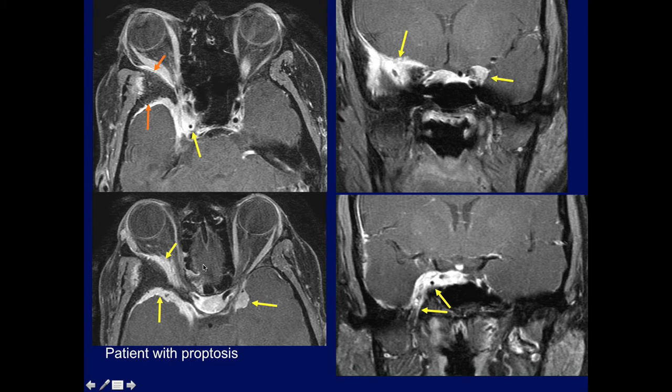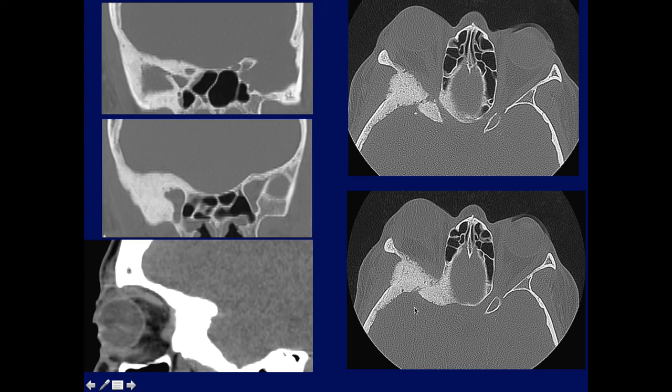And in this case, not only did it go all the way medially, but it also crossed to the opposite side along the floor of the sella, where there are a lot of veins and so on, so it's easy to cross over. And this actually went down the cavernous sinus all the way to the foramen ovale. And note again in the same patient the tremendous hyperostosis of the greater wing and the lesser wing of the sphenoid in all projections.